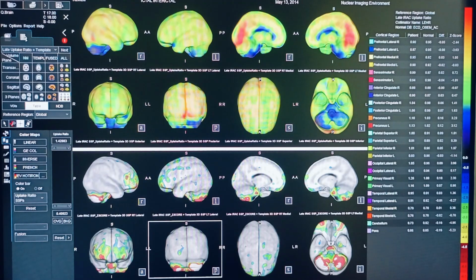if it is Alzheimer and dementia kind of diseases and you are using FDG, then you have to select pons as a reference. For ECD and HMPAO, you are seeing actually the cortical areas, so you can select the global instead of pons. So here you can see the negative Z scores and corresponding perfusion areas. So now the perfusion image as well as that is clinically correlating.